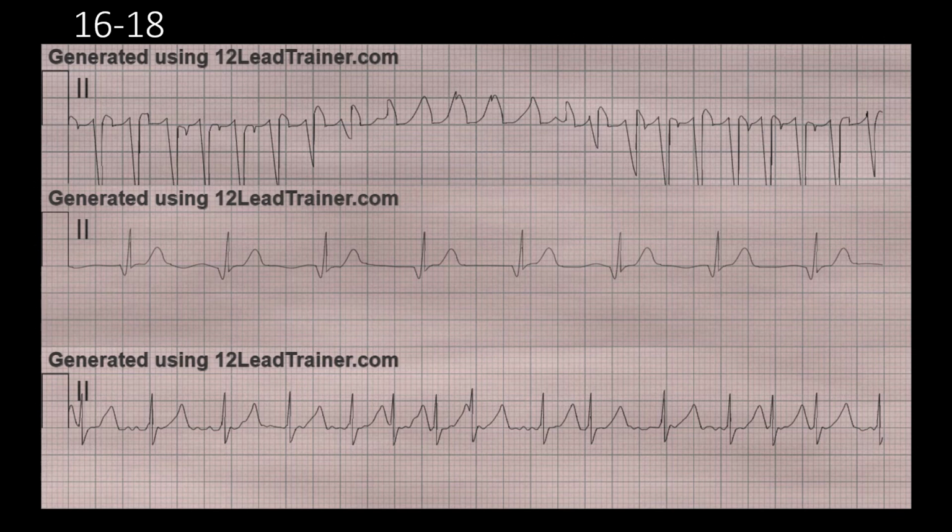So the biggest thing to take into consideration here is right here it looks like they're all negative, pointing downwards. And then right here it transitions, and then it's facing upwards. And right there it transitions back into downwards. So the R wave, or the peak of the complex, goes from here up and then back down.